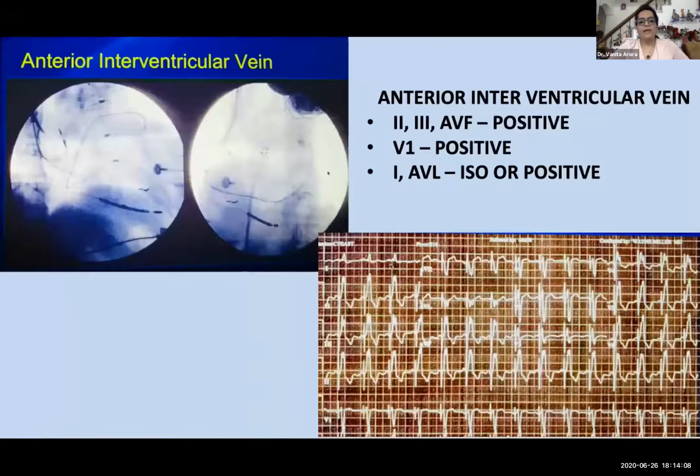In case the lead is in the anterior vein, then you have placed it towards the septum. You have gone in the anterior vein. Instead of going on the lateral side, you have gone towards the septum. And when you are towards the septum, what you will have in the ECG is 2, 3, aVF being positive, lead 1 is positive. Even if you have V1 which is biphasic, there is an initial positive response. This cannot be a good position for this patient, and it is recommended that instead of aiming for electronic repositioning, you should replace the lead to a better path.